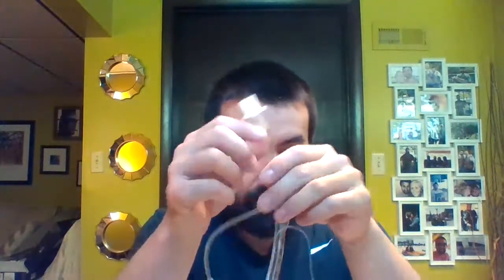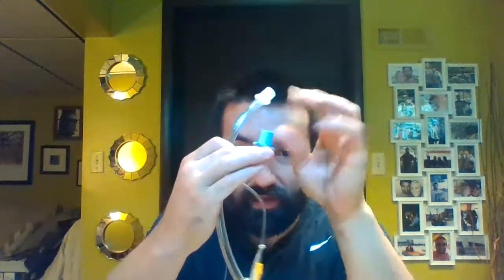All right, so parts of the ET tube, while we're on it here and we're moving past the stylet. First off, the 15-millimeter adapter. No matter what your tube size, this outer part is going to be 15-millimeter outer diameter. And that allows us to hook to all of our ventilators, suction catheter or inline suction, ambu bags, all of our essential equipment. The only thing that changes as the tube size changes is the size of a hub that sticks down into the tube to keep things put. So you can see this little piece changes in size, but this is always 15 millimeters, even if we have a tiny little kid's tube.